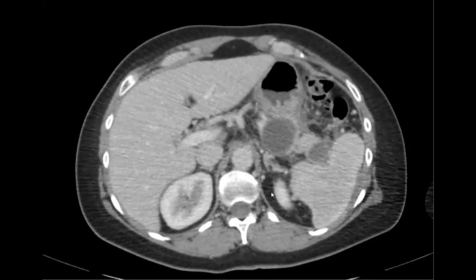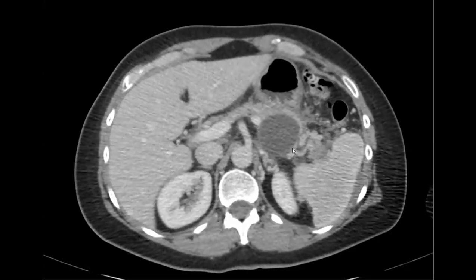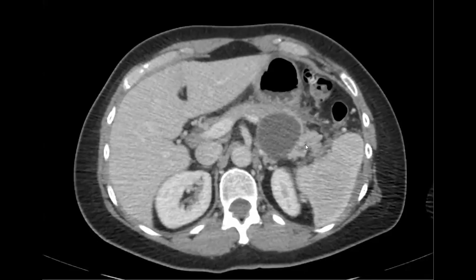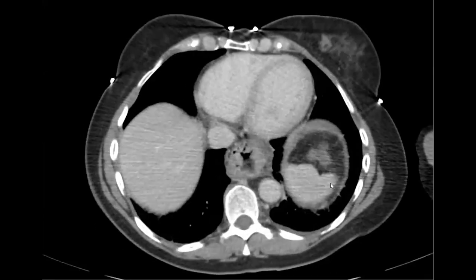Okay. I was thinking the duct perforated at the tail right there. Exactly. I think it obstructed the duct, and then that thing busted, decompressed out, and caused the left upper quadrant pancreatitis. Yeah, I see.